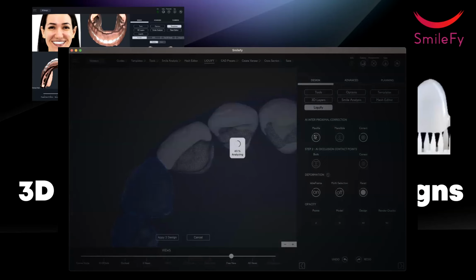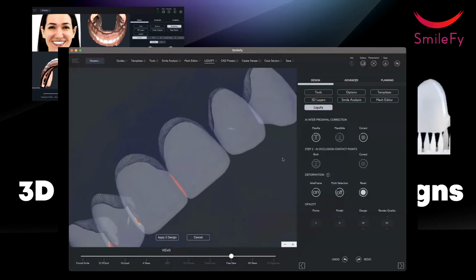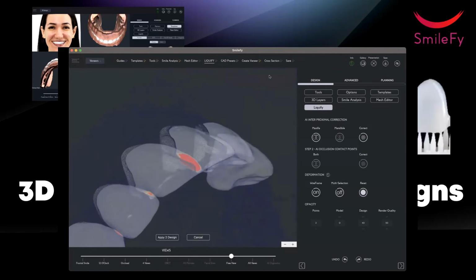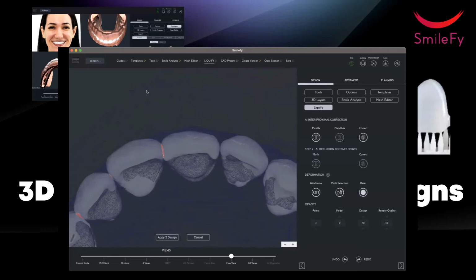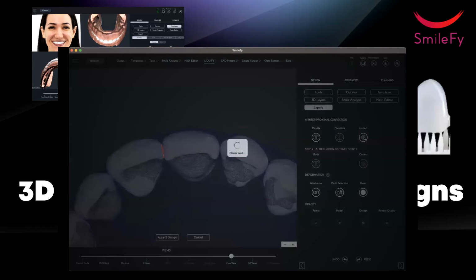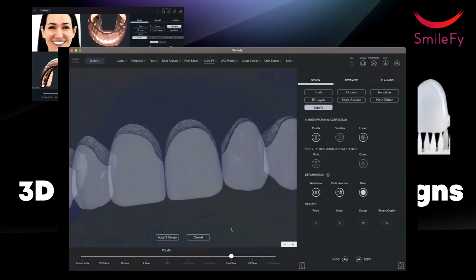That's the best animation and scanning of every single triangle, of every single detail of the template. And the analysis shows me, yeah, your interproximal contacts are not so good, Ralph. So what did you do? Yeah, I intersect the teeth. Okay, click on correct, done. One click, everything is fine, everything is done.